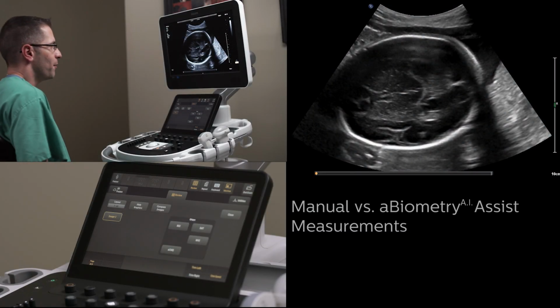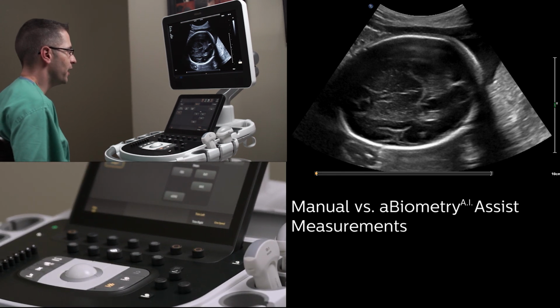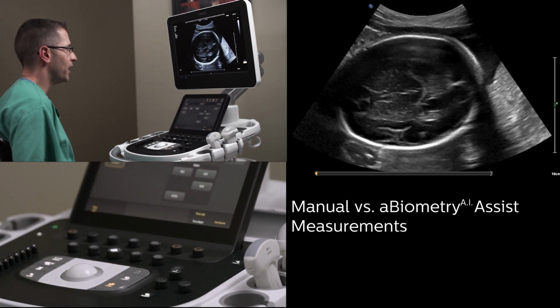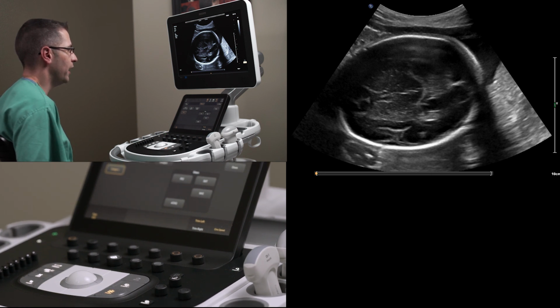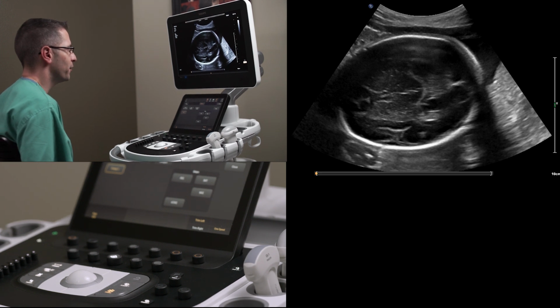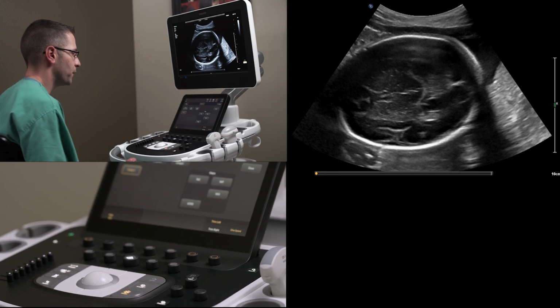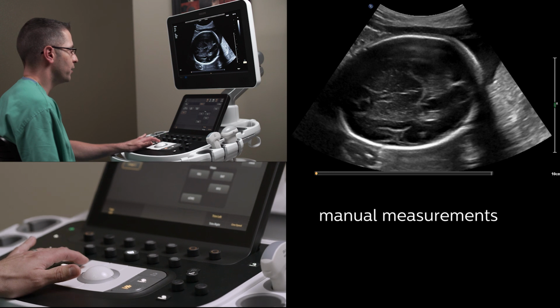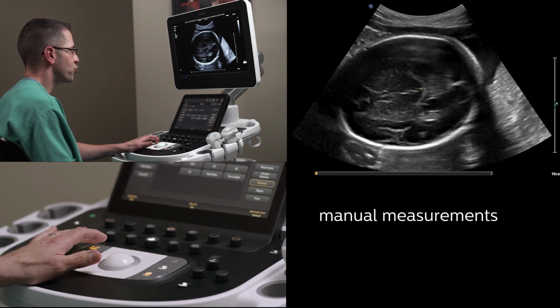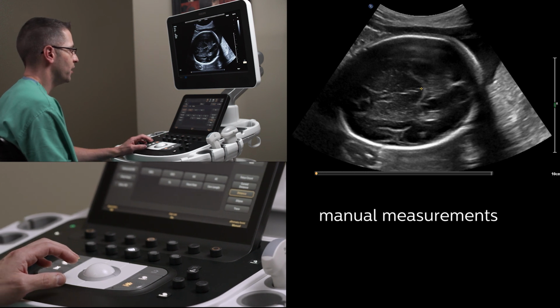All right, we're going to do a demo of aBiometry Assist technology on the Philips EPIQ and Affinity systems. What I have on the monitor here is an image of the fetal head. I'd like to walk you through capturing both the feed from the screen as well as what goes on the touch screen. Traditionally, we have to use our left hand and click measure. I'm going to change this to manual to simulate what we would do in a manual fashion.